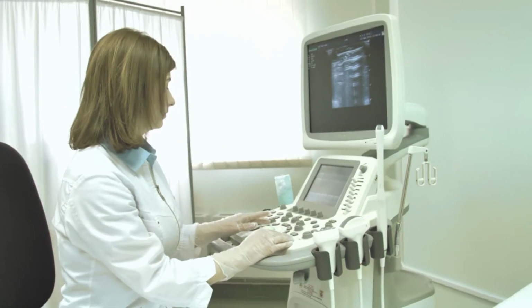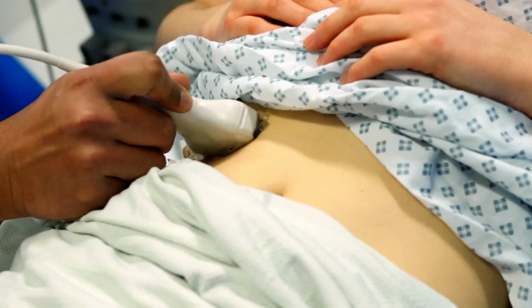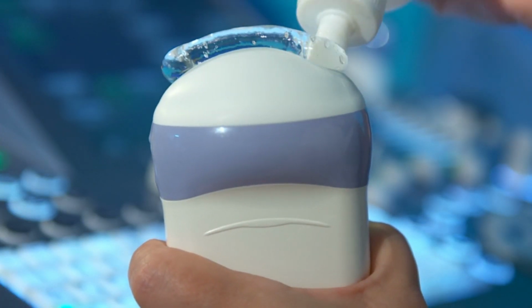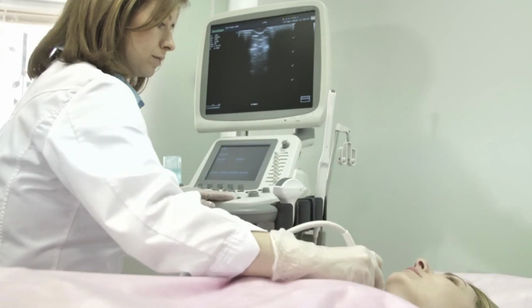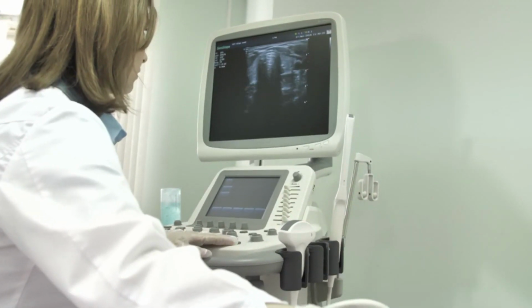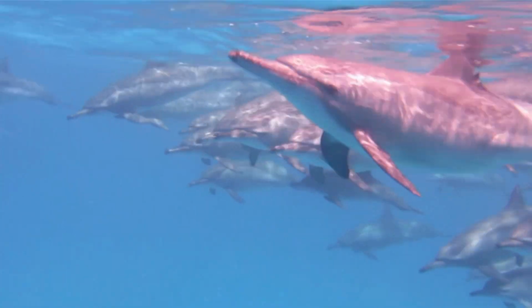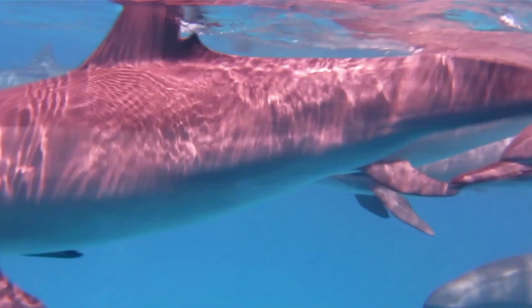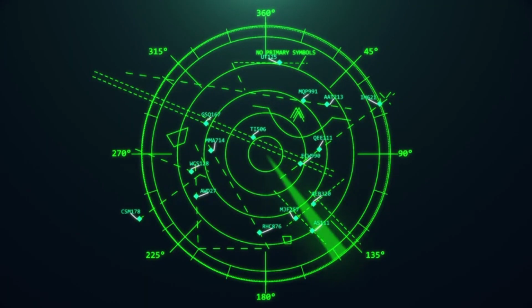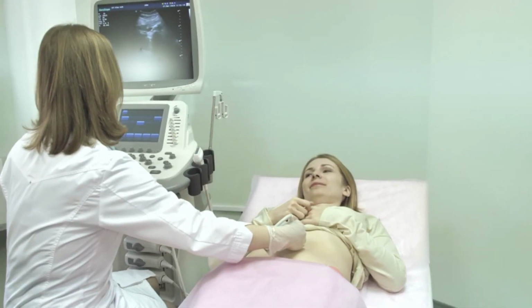An ultrasound machine is a small device that is easily wheeled where needed. The operator controls a computer which has an attached probe that is covered with gel, then placed on the part of the patient where the imaging is needed. As the name ultrasound suggests, the probe sends sound waves into tissue. Then it listens for their echoes, and the computer can make an image based on those echoes. The technology is very similar to how dolphins and bats can sense their surroundings in the dark and how submarines use sonar. Like the word sonar, the images made by ultrasounds are called sonograms.